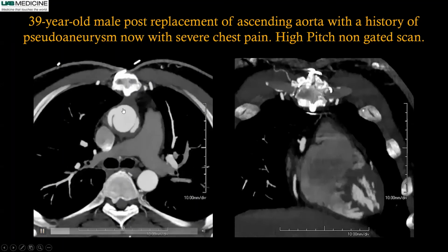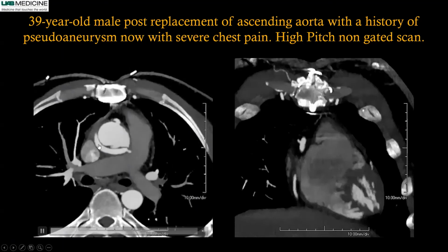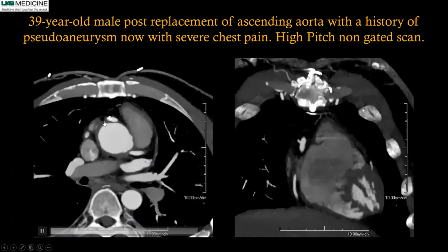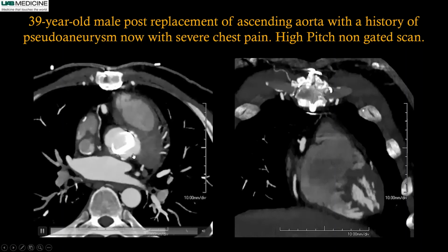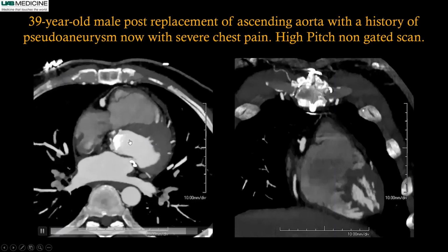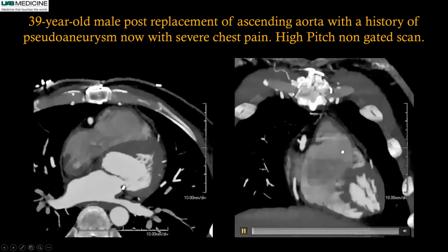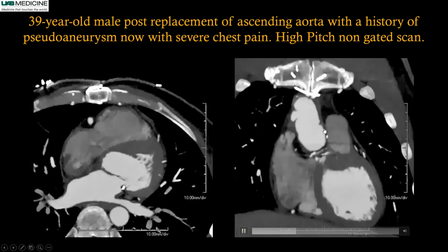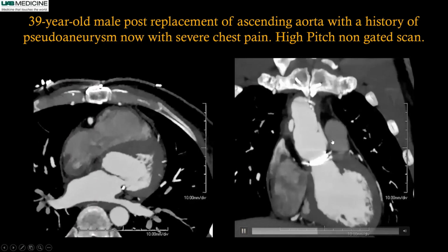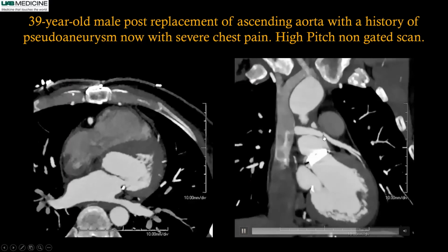And you can see this patient had undergone a Cabrol procedure with a large graft which surrounds the ascending aorta, and then the left main is connected to that. And the patient had an aortic valve replaced. All the other vessels were normal, but if you look carefully, the Cabrol graft to left main or LAD junction was tightly narrowed right here.